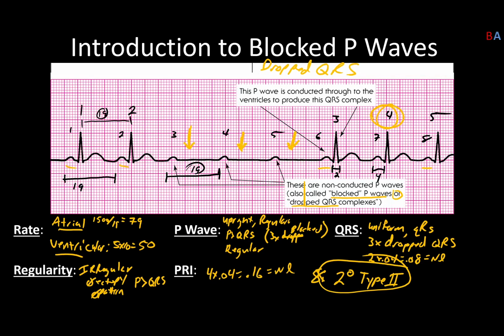To finish out with this one, for the advanced arrhythmia group, I realized going through this was pretty slow, but what's important for you to note is that this is a high-grade block. And why is it a high-grade block? Because you have more than 2 P waves in a row that were blocked. So this is a second degree Type II high grade.